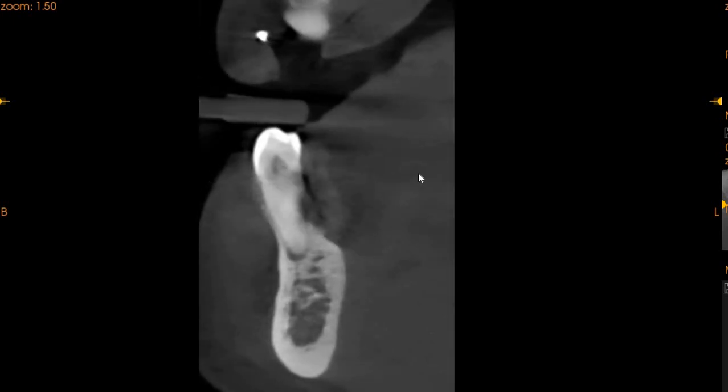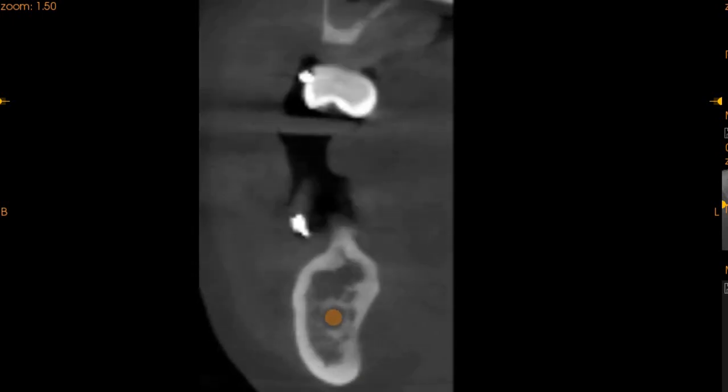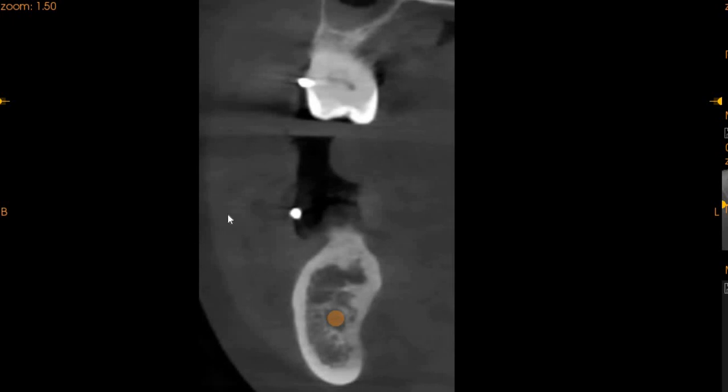This is the first premolar on the lower left hand side, again significant bone loss, periapical radiolucency. This appears to be periodontally compromised as well. The lower left second premolar has no bone support, absolute bone atrophy and infection, and a periodontally compromised tooth with a periapical radiolucency can be observed here. The lower left first molar appears to be edentulous. We've got a very thin ridge, approximately 4.9 millimeters, and only 10 millimeters to the inferior alveolar nerve.